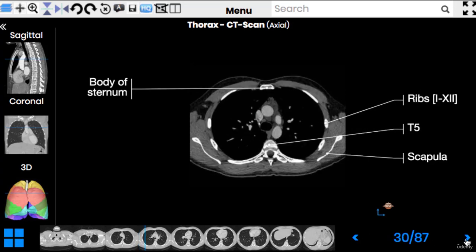At the level below we do not see any arches, but what we have now is the ascending aorta in front and descending aorta behind. The ascending aorta leads us to the left ventricle, and the descending one is going to continue down to the abdominal cavity.